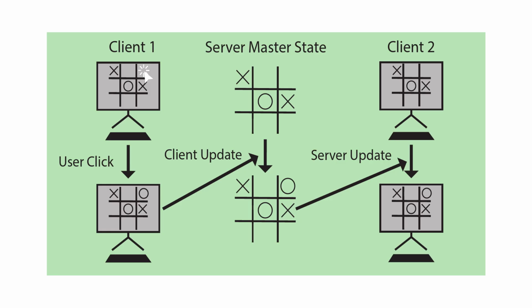The server's role is to store, update, and distribute a master list of states, which ensures each client's state and stimuli are synced. You will need a Mac or Linux computer to deploy the server. Keep in mind, the server is not an instance of BCI 2000. It is a separate application that interacts with client instances of BCI 2000. We'll demonstrate server deployment on a Mac.